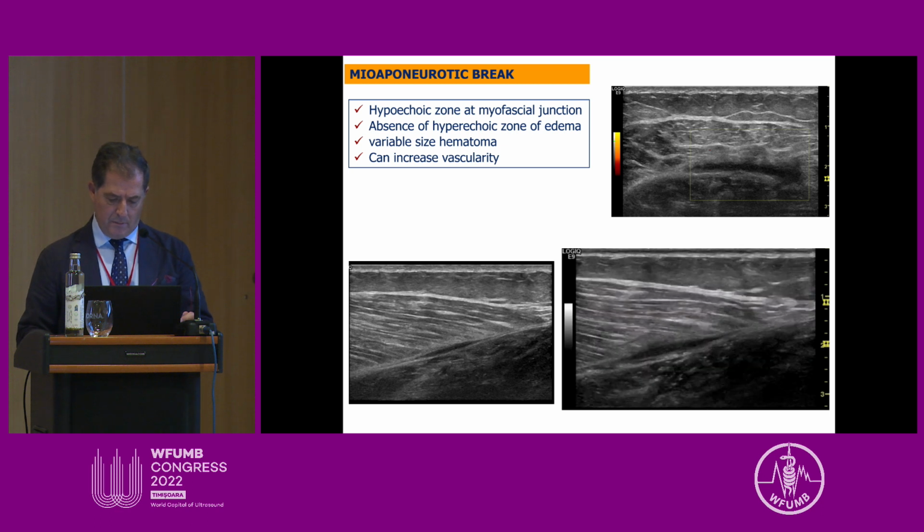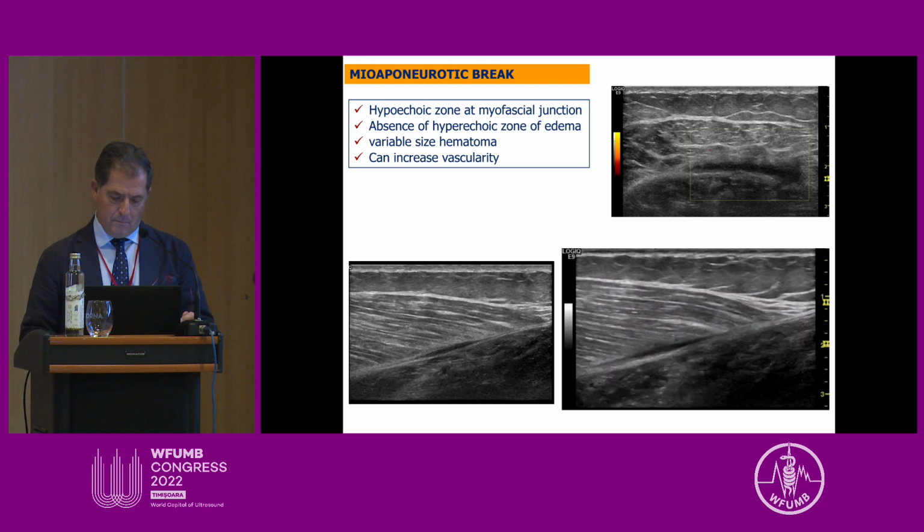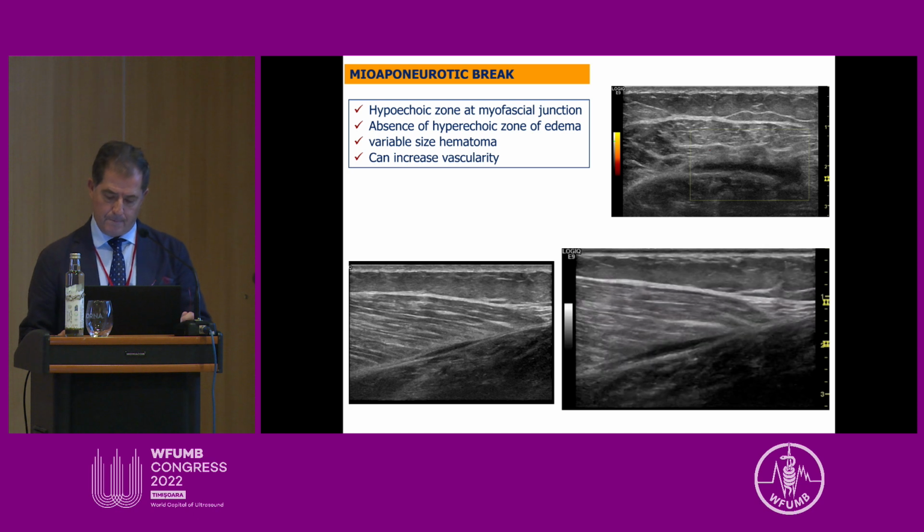And another kind, this is in the area of the rupture. In this case, the perimysium is broken, and so the anechoic fusiform rupture appears between fibers and the anterior aponeurosis.